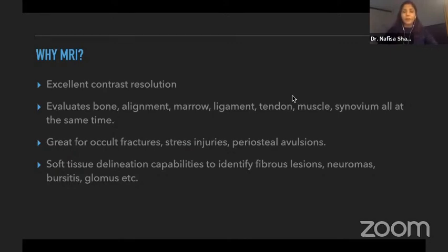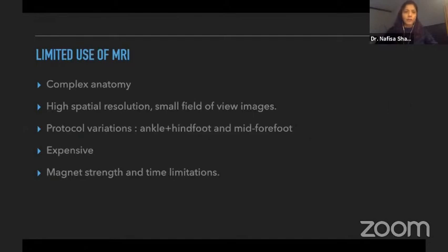It's great for occult fractures, which would be missed on an X-ray as well as a CT. And it's good for periosteal avulsions as well, and we'll see a few examples of that. It helps to characterize soft tissue lesions also.